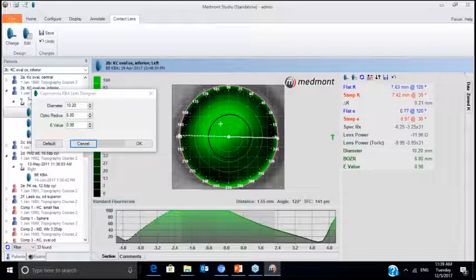And you'll notice on the graph down below, as I take this axis line around, that lens is bearing heavy on the cone. So we need to go steeper still. So let's continue to steepen the base curve, see if we can get that contact lens off the cone. So this is good. Now we have our contact lens clearing over top of the highest point, the diseased tissue.